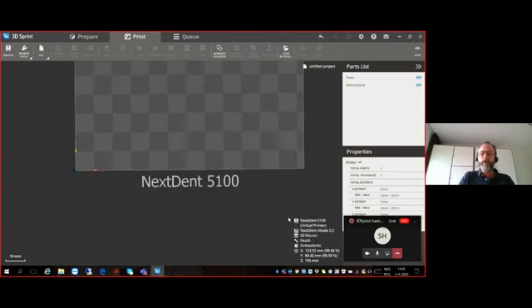Now in the right lower corner, you can see that we have selected the printer, in this case a virtual one, because due to Corona I'm also not at the office. We selected the material, NextDent Model 2, 50 micron build layers, the color is peach, and the orthodontic build style.